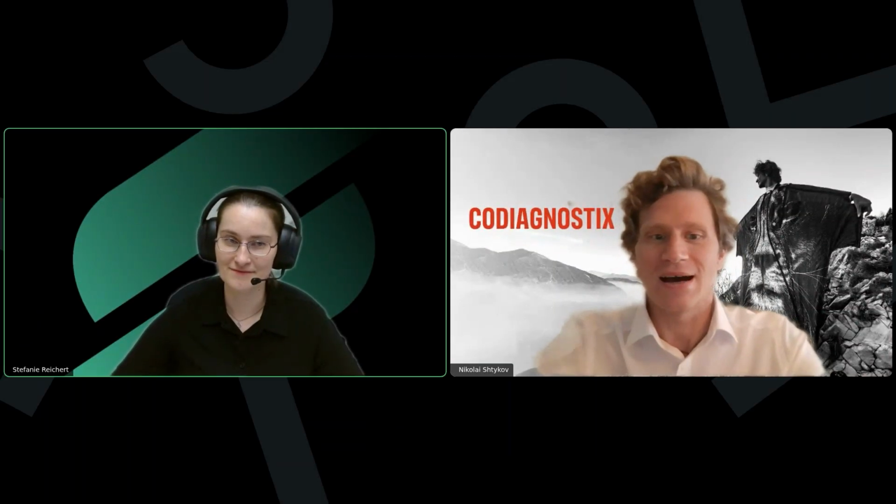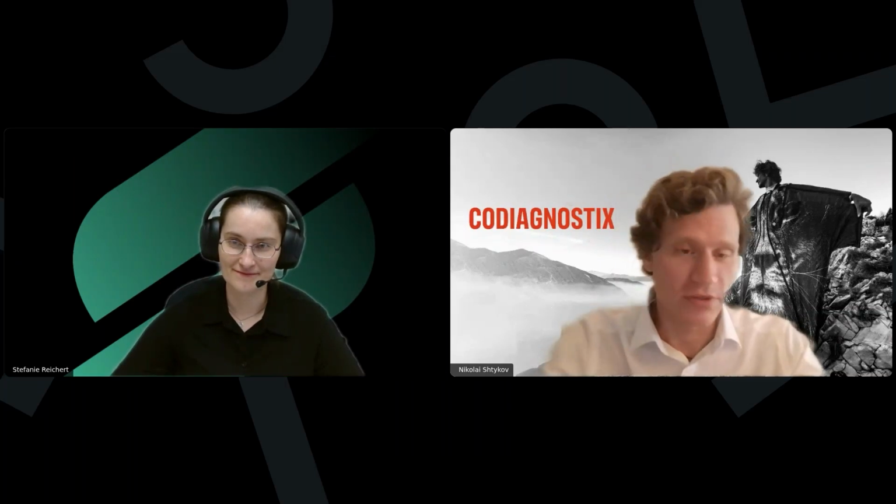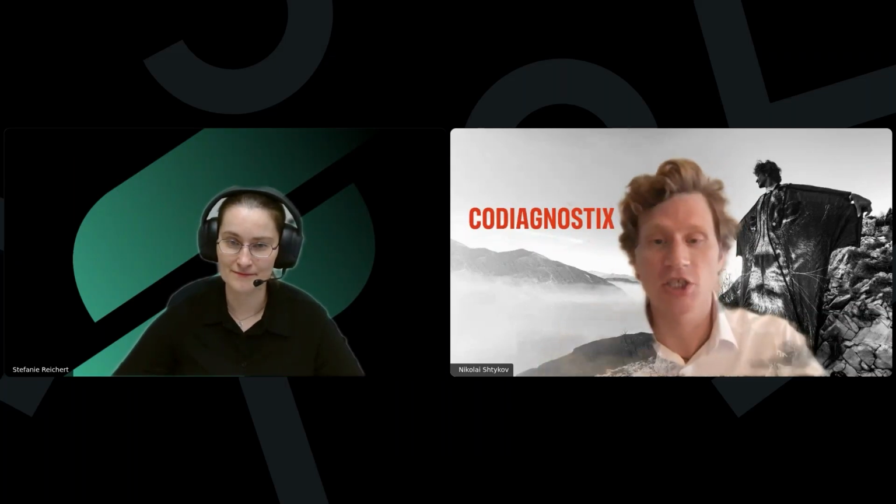Okay. So I will start to introduce myself. My name is Nikolai Shtykov. I am Global Training and Education Specialist in coDiagnostiX. And today we will talk about the new feature we now have in coDiagnostiX. It's called jaw filling functions.